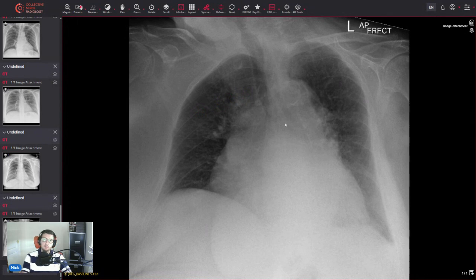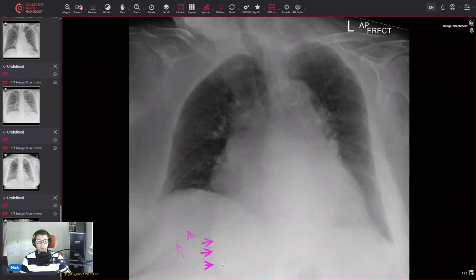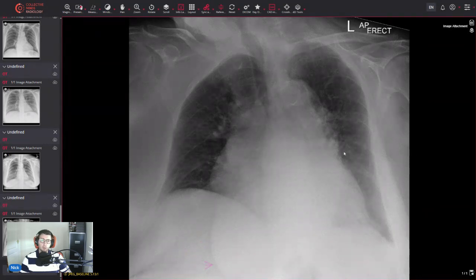The heart is kind of stretched outwards because of the projection. This aorta looks unfolded because we're seeing it in a different kind of orientation. And actually, if you look under here, at first glance, it looks like there could be a hiatus hernia. We've got this soft tissue opacity that's extending over the central part of the lower mediastinum. But if we take a look down here, we can see these shadows here and here. So this is actually breast that's migrated over the central mediastinum because the patient's rotated to the right. So really important to recognize position, soft tissue anatomy and what it might be so that we're not confusing it with a hernia.